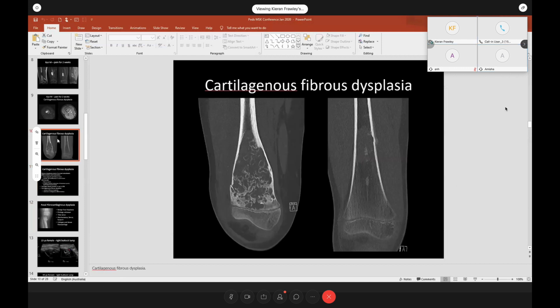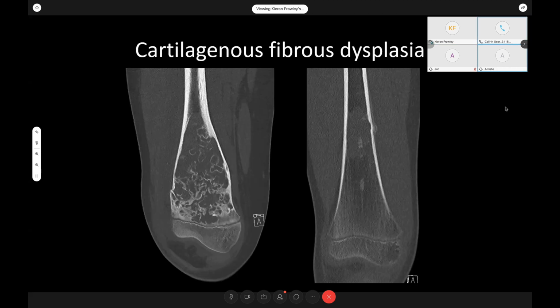Okay. On the first case, the expansion is very, very uniform, endosteal thinning and stuff. But you know what's interesting? Usually fibrous dysplasia does that. Going back to fundamentals of what lesions look like, scalloped margins, arcs and whorls tell us it's probably a cartilaginous-based lesion. And the fact that you've got some areas of ground glass says it's fibrous dysplasia. As long as you could put those two together, you come up with something reasonable at least, and you could say that it's probably benign, given those parameters and what it's doing to the bone and soft tissues around it.